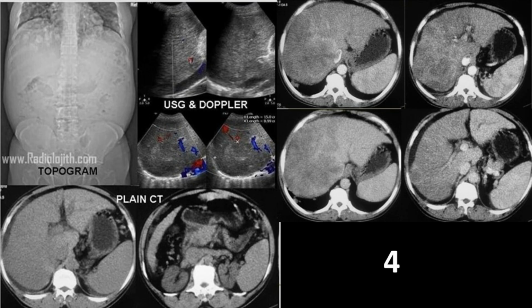Now we will go to the difficult fourth case. There are too many findings and please give your attention. If you want more time, please pause the video. Take your own time and give the diagnosis. Can I give you the answer?